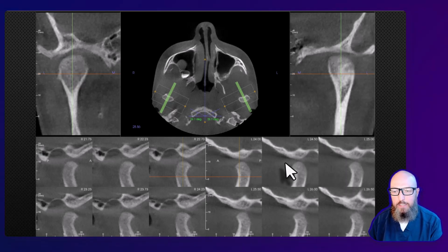And so if you see this in a child, you're not going to diagnose it as arthritis right away. And we'll talk about juvenile, so hold off on that idea. But if I don't see obvious erosion or severe radiolucency throughout the condylar head, this is just normal.